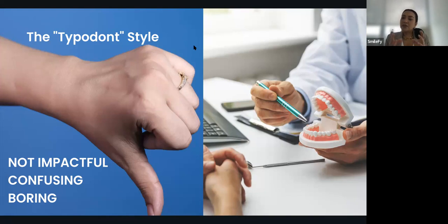So I would say the 2D smile simulation is something that was created for the patient's delight, for the patient's experience. We know that our experience talks for us. When you have a patient in front of you, you have the chance to see, okay, I need to rotate this specific tooth.